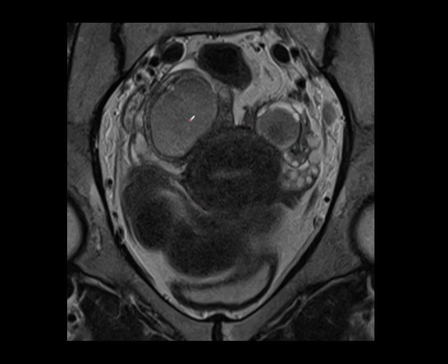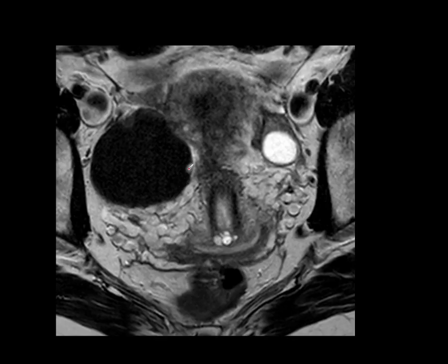These two hemorrhagic cysts here are not very dark. That's probably due to the fact there's not much hemosiderin within the cysts. There's probably a large fluid component, whereas this hemorrhagic cyst has probably a very high concentration of hemosiderin, which is dephasing the proton spins. And it's just another appearance of a hemorrhagic cyst.